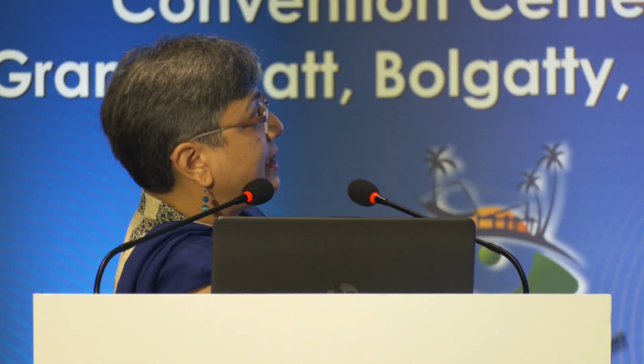So having green, having red and yellow does not preclude glaucoma. So green is not normal. If that's one message that we could take from this case, you can have manifest glaucoma and your wonderful OCT might still show up green, but it's not normal. So that's one. Second thing, structure and function on OCT if it's not correlated. Now, this is a lovely structure-function analysis which is possible if you have the Cirrus and the Zeiss visual field machine together, or the Humphreys together.